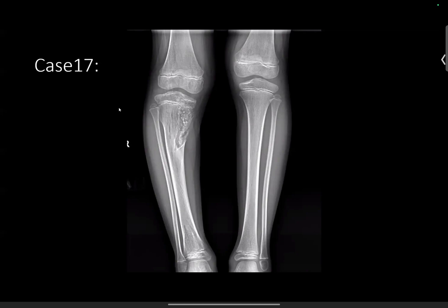This next case, we have a lesion that's kind of a streak-like lesion with multiple little chondroid, little punctate calcifications. This other paintbrush streak lesion in this metaphysis. So you have a leg length discrepancy with multiple lucent lesions, some with chondroid matrix.